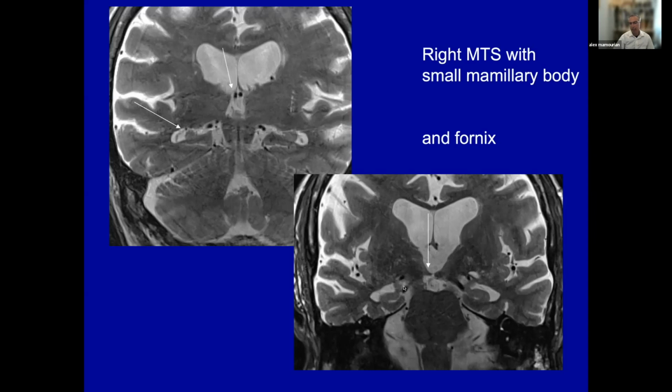Now, when you look at this image, I can tell you when I started out in my career in neuroradiology, this was a relatively new concept, and it's the sort of thing that amplifies this saying that I've heard in radiology, and it goes, "I'll see it when I believe it," in the sense that this observation is really quite difficult if you're looking at images without history and without pre-knowledge of all the findings of mesial sclerosis.